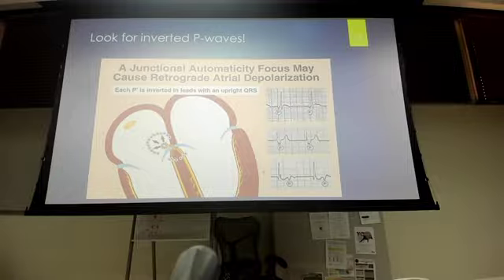We very, very rarely see anything like that in real life either. I want you to notice though, for these that have the P wave after, it's not important to identify that the P wave is after, it's important that you identify there's no P wave before. Okay? I don't see a P wave. Why don't I see a P? You can hem-haw all day long and say, well, there's my P, I think that's a P. It doesn't matter. What matters is we don't have it before, we don't have it before, and here we have it before, but it's inverted.